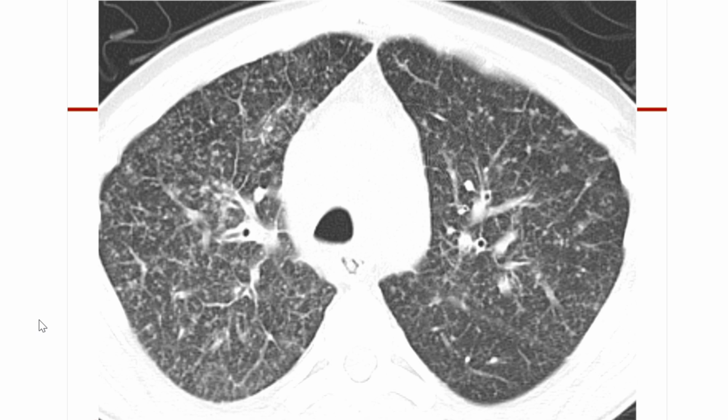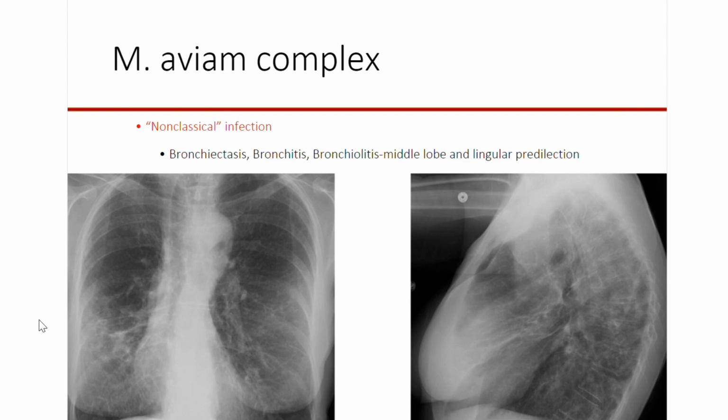This cannot be perilymphatic, all right? We know that perilymphatic should particularly involve the fissures and the subpleural surfaces, and that's indicative of sarcoid, right? This is basically on every square inch of this patient's lungs, there are micronodules. That's going to be miliary.